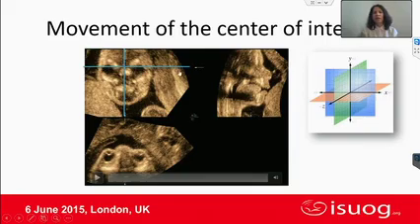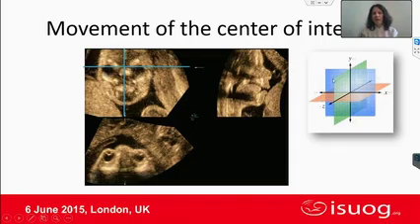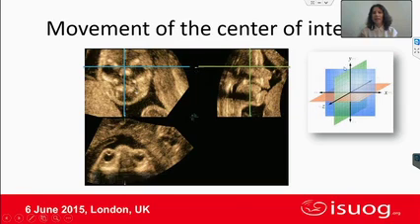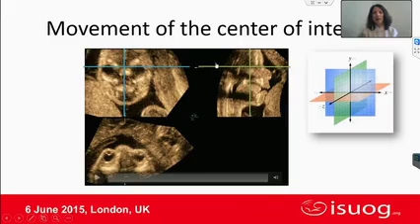So this is the blue, look at the blue plane. This is the x-axis and y-axis. You can see that the blue plane has x-axis and y-axis. Now let's turn 90 degrees to the green plane. The green plane, here it is, has the same y-axis as the A plane. They share the same y-axis, but the green plane has the z-axis here. So this is the z-axis.